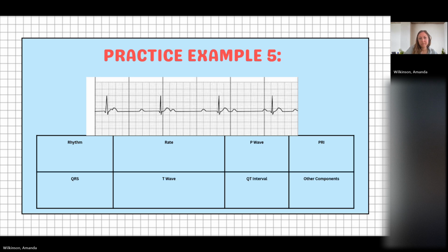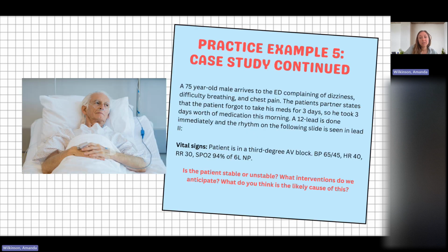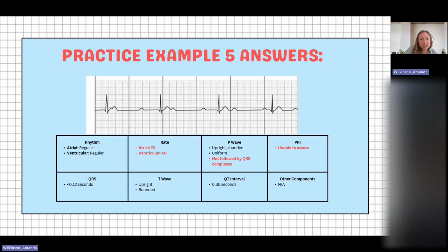The 3rd-degree block. Is it a 3rd-degree block? Yes, you got it. So if we can see here, I love this laser pointer, you can see that the P waves and the QRS complexes aren't communicating to each other. It's very random.